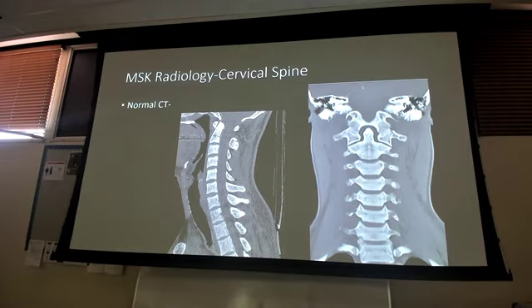Alright, so normal CT, again, gets the bony structures more clearly. This is why we do this. Look at how much detail I can get on this odontoid and on the interaction between the lateral masses, and it has nothing to do with patient positioning and how well they open their mouth or not. I'm just scanning this slice going straight in, right?